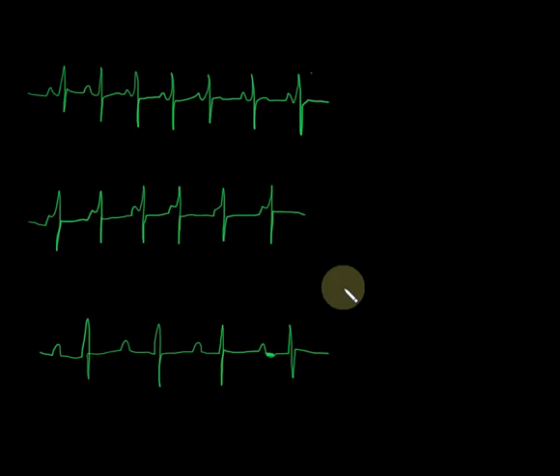I wanted to give you the name for this. So these rhythms still originated. They've got an upright, round, symmetric P wave. And they still generate actually at the sinus node. So the sinus node fires right at the beginning here of the P wave. Then the atria depolarize. And then there's that extended pause here. So we have to kind of describe what's happening. And then you've got a narrow QRS. So, and if I wasn't hand drawing these, you'd have a T wave as well. But essentially, we've got a rate, R is regular, we got a rate of 40 on this.